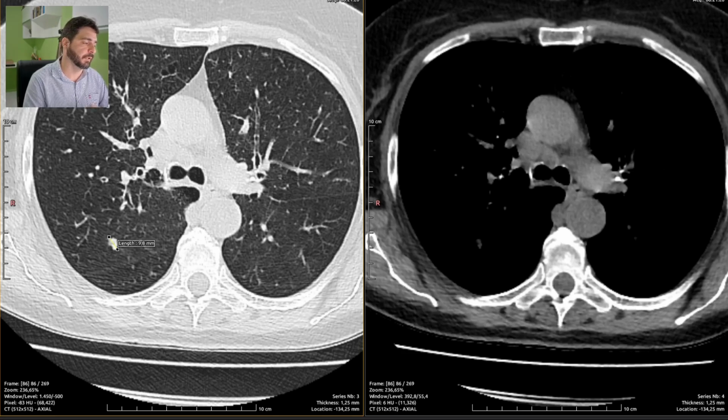Yep. Now the micronodules. So, a bunch of micronodules.